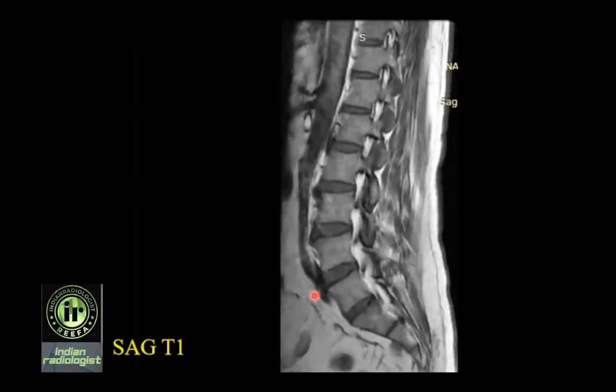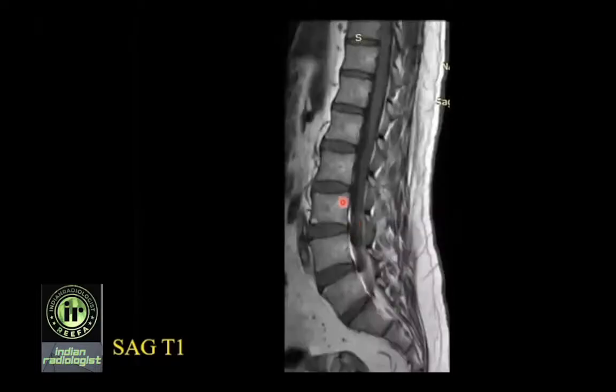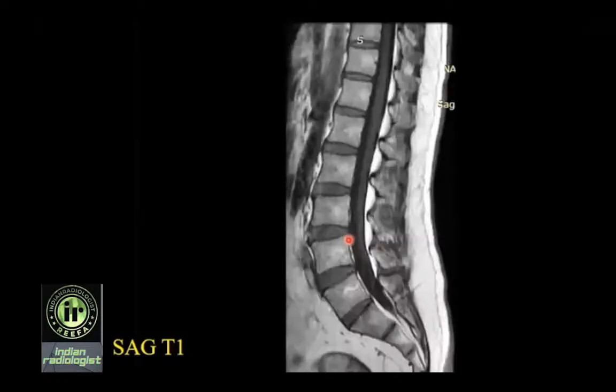Coming further medially, at the level of lateral recess, we see fat in the lateral recess. Because this patient's canal is nice and wide, you can see fat in the lateral recess very well. Coming in the paramedian section, you can start seeing the spinal cord and conus medullaris, little bit of cauda equina nerve roots, anterior epidural fat, nucleus pulposus, annulus fibrosus. This is bang midline, vertebral bodies, nucleus pulposus, annulus fibrosus, conus medullaris, cauda equina nerve roots, posterior epidural fat, anterior margin of spinous processes. You measure your canal over here.